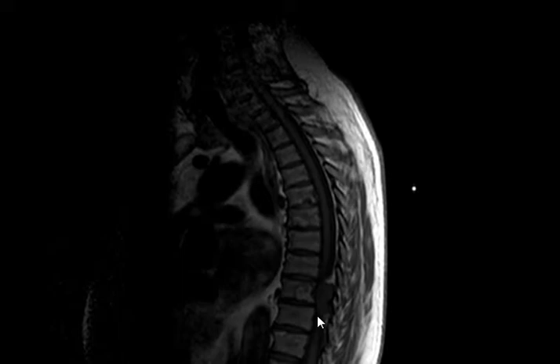Second, location. It's at the level of T7 or T8. Is it extradural, intradural, extramedullary, or intramedullary? We see it by the contrast. But before contrast, see the axial. You go to the axial to look for where it is located and where it originated from.